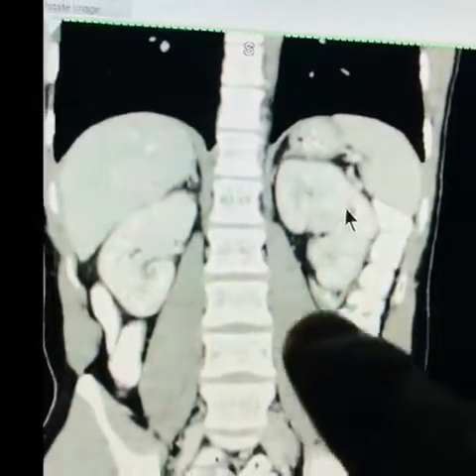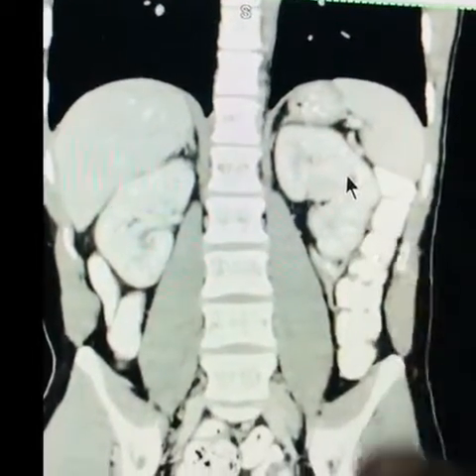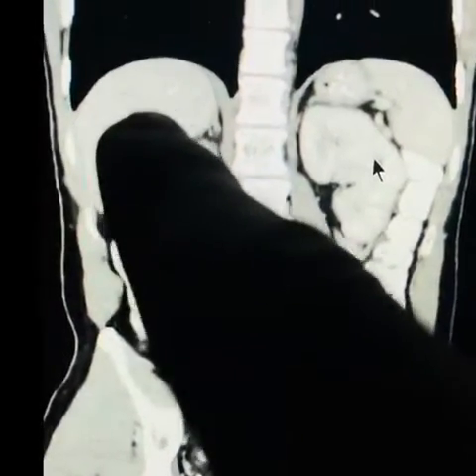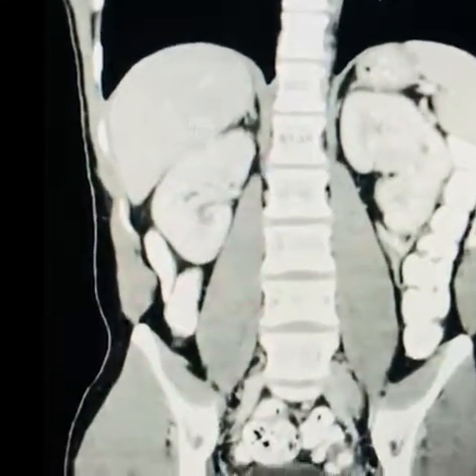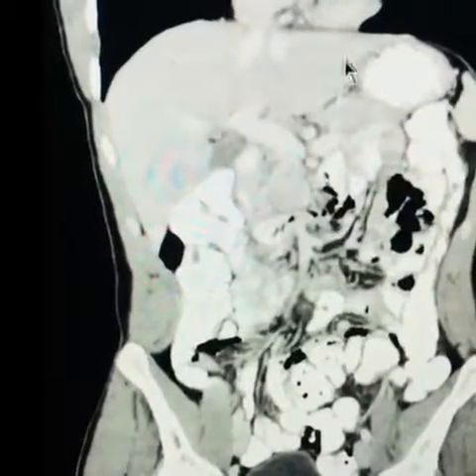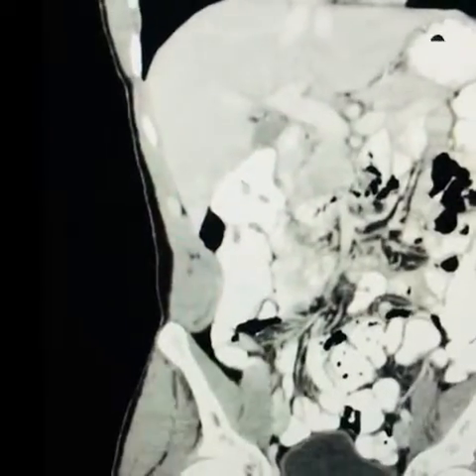I also want to say, the right side of your screen is the left side of the body. So this is the left kidney, that's the right kidney. This is the liver, and the liver is on the right side of your abdomen. The liver is massive. You can see it actually stretches all the way here and comes around.